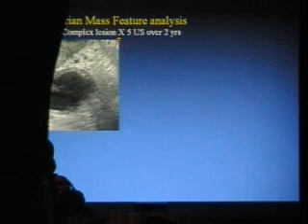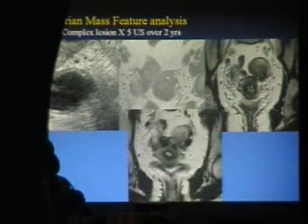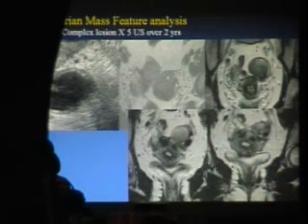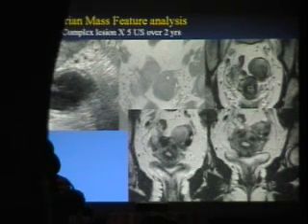Here's one from ultrasound, 5 ultrasounds over 2 years. The mass remained exactly the same. It did not change. It's got a relatively thick wall. There's a little nodule here. It's primarily cystic. Then a bunch of MRIs, finally, with T2 weighted images where you can see in multiple T2s that we have this mass, but interestingly, on T2, very low signal. So relatively homogeneous, low T2 signal, appears to clearly lie within the ovary. We see a few follicles around the outside of it, and it has what's known as shading. It has this drop-off of signal towards the center of the lesion.